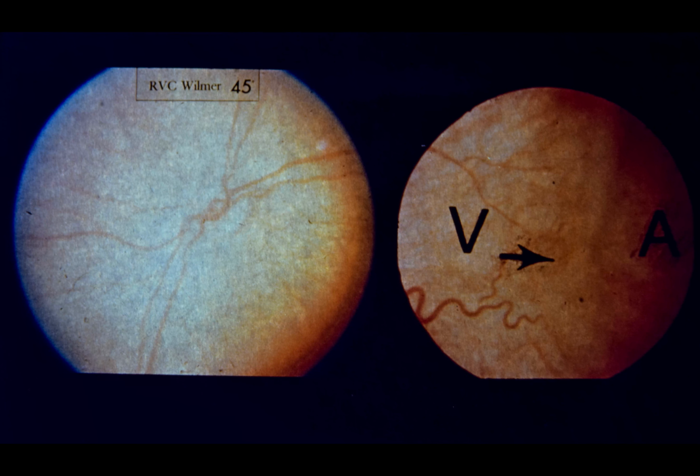Slide 45, active peripheral RLF with normal posterior pole. This 4-month-old white female had a birth weight of 2 pounds 12 ounces and a gestational age of 7.5 months at birth. She illustrates the need for indirect ophthalmoscopy to resolve peripheral lesions. On the left, note that posterior pole is essentially normal. There is a very minimal degree of retinal vessel tortuosity, which is certainly not beyond normal limits.